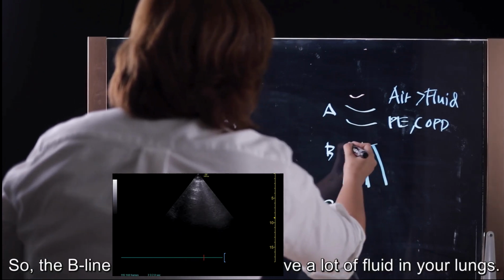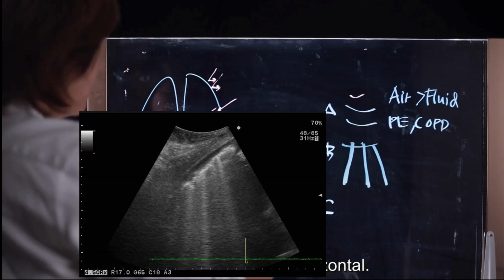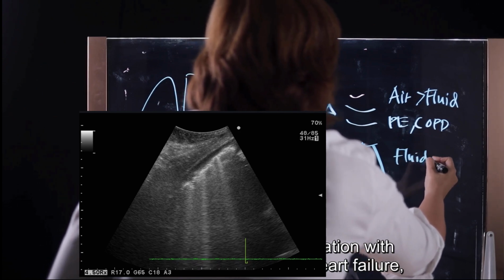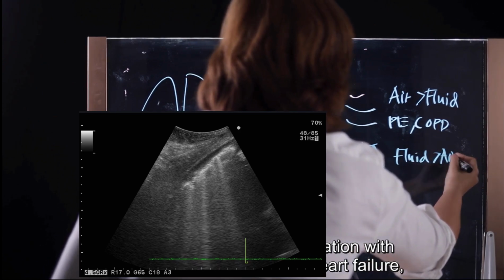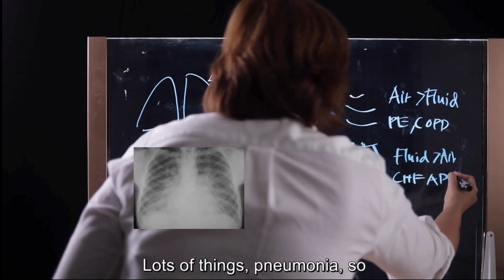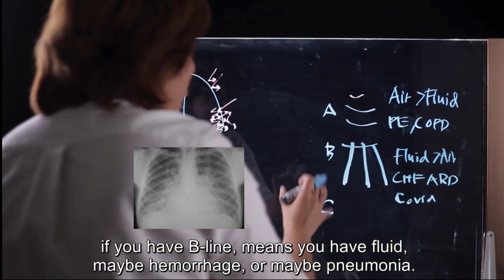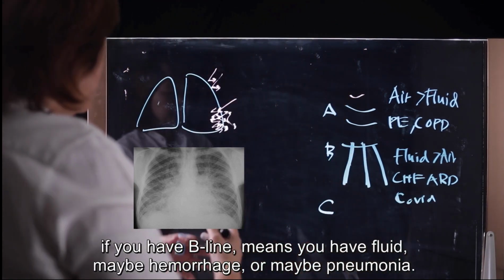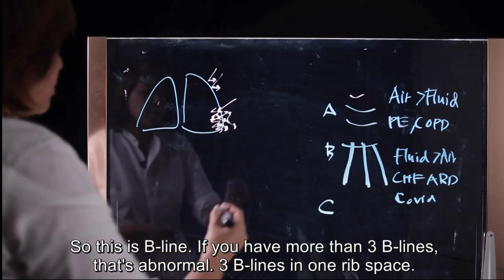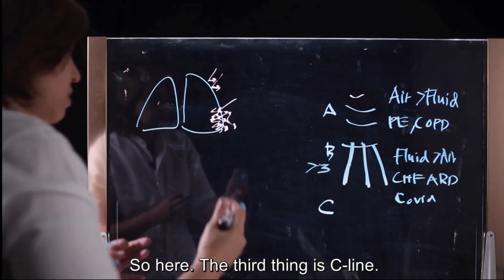B line happens when you have a lot of fluid in the lung, and it's vertical, it's not horizontal. You can see this in any situation where you have fluid in the lung. Let's say you have heart failure, ARDS, COVID, a lot of things, pneumonias. So if you have B lines, it means you have fluid, maybe hemorrhage or maybe pneumonia. So this is B line. If you have more than 3 B lines in one rib space, it's abnormal. So I'm just going to note that here.